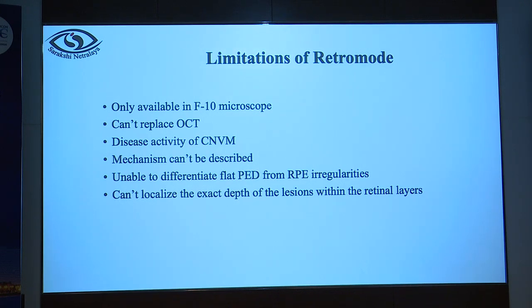So this is the advantage of this particular new system: it is a true near-normal color image, because it uses 3 lasers. It gives you SLO-based images which are near natural colors. It gives you all the facilities plus the additional advantage of retro mode. The clinical implications, what we could understand, and from the literature which is very scarcely available, tell us that it gives you the involvement of the RPE in a better way. And here we could document that not only the extent, but the actual number of RPE cells involved can be more. That is what we are learning in various retinal disorders. Thank you.